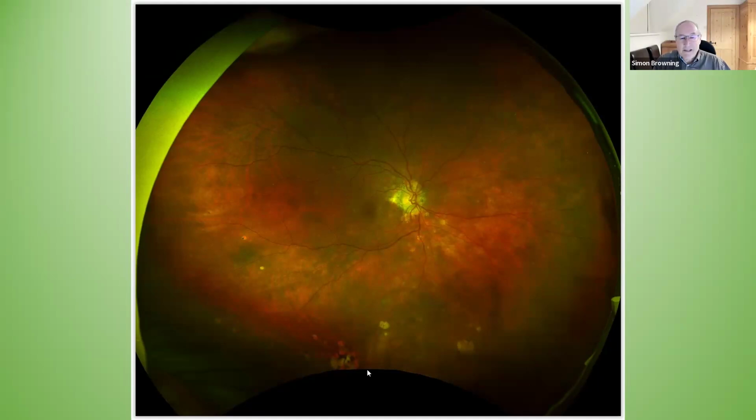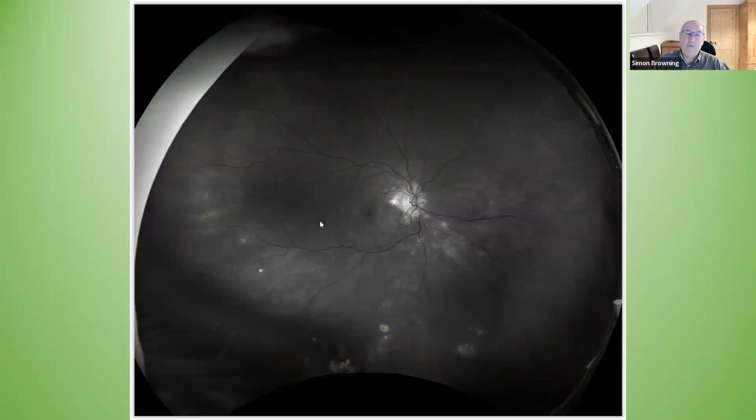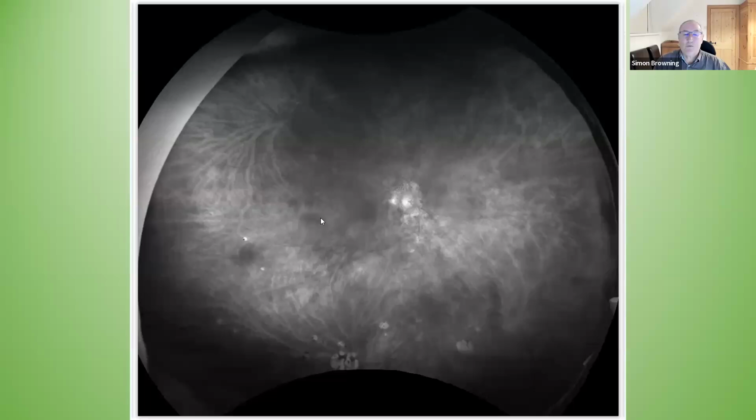But again, you see these scattered lesions affecting the posterior part of the eye here, and they will be present on all levels when you look at them. And you see the dropping out of the retina and pigmentation as a result of chronic old scars of uveitis here. And the involvement around the optic nerve head here.